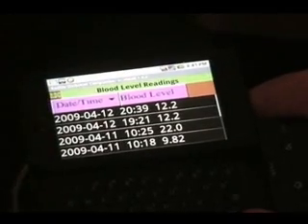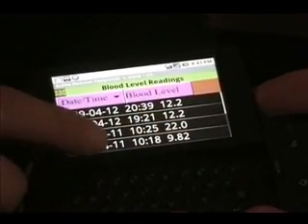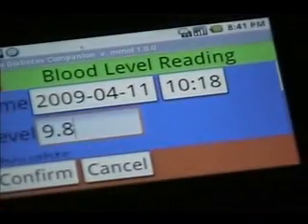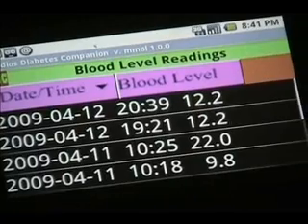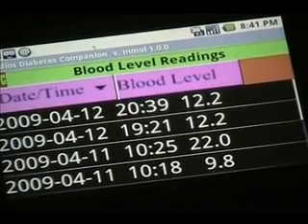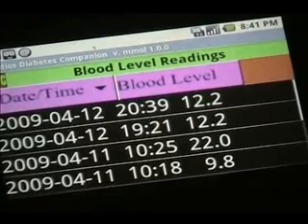There's the most recent reading. And as I said, it would be good if you keep the decimals. And the edit mode is pretty much the same. I'm going to get rid of that and just hit confirm, and then everything lines up nicely. But if for some reason you're doing hundredths, if there's someone in the world that is doing hundredths, we could adjust it to handle that. But I believe it's mostly tenths that you have to deal with.